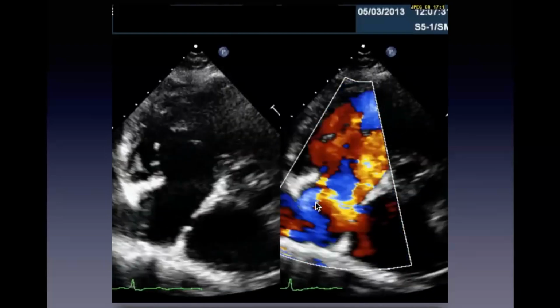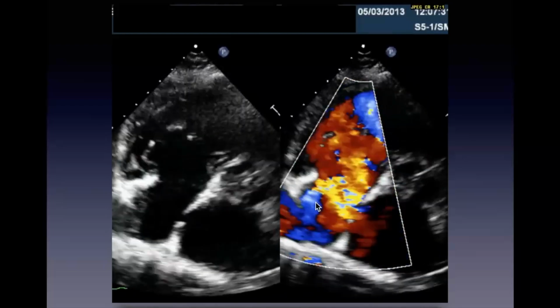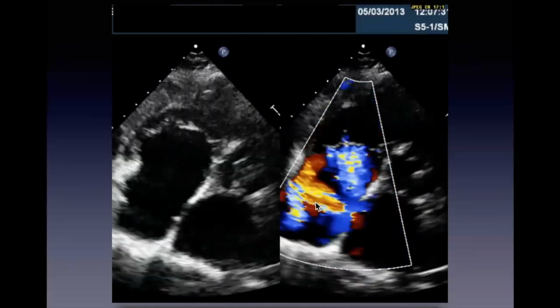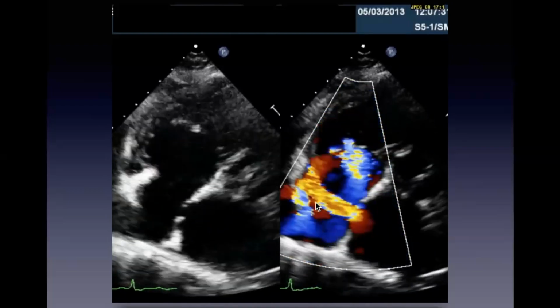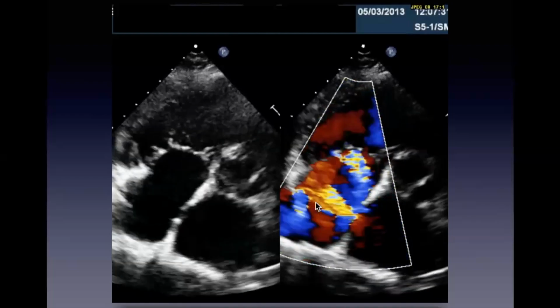Color Doppler mitral valve, apical 2-chamber view is the bicommissural view. That color Doppler jet will almost always look larger for central jets on that view compared to the apical 4 and the apical 3. So I've seen sonographers call moderate MR based on the apical two-chamber view, where it looks mild in other views, and it's just mild.